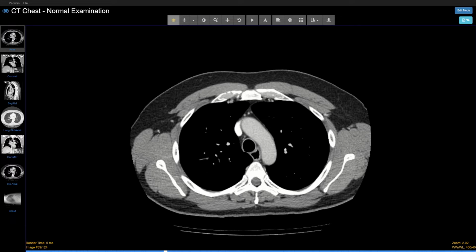Now, we've intentionally oversimplified things here for now and left out protocols like low-dose CT chest and high-resolution CT chest, but that's the basic principle that you want to understand for now, and we'll get to the rest later. For now, let's get back to this CT and start looking at the anatomy in detail.